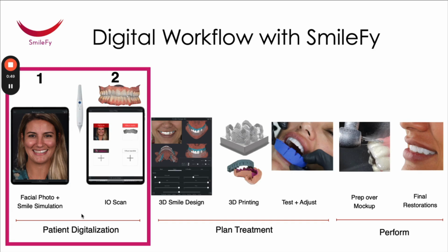result will look like. This week, we are going to talk about the treatment plan that allows you to transition from a smile simulation to a 3D design mockup. Using the automated 3D design workflow, we are going to create a mockup in about 10 minutes based on the smile simulation and the intraoral scan. In the end, we are going to export our mockup design and test drive the mockup in the patient's mouth.